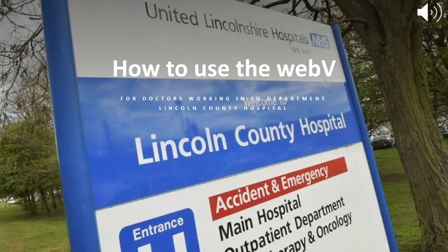Good morning, everyone. So today I'm going to take you through a brief summary of how to use the WebV, mainly for doctors who work in the A&E department, Lincoln County Hospital. First of all, you need to find the icon of the WebV on the desktop. Then you will use your own login and password to log into the WebV program.